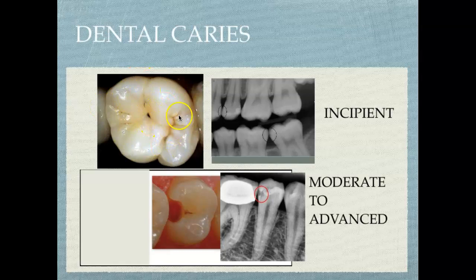So let's look clinically. We might look at a tooth and it has some deep fissures here, that's for sure, and grooves, but perhaps it is just a beginning decay that is diagnosed by the dentist or the hygienist. So that would be classified or categorized as incipient decay. Usually it's in the enamel, but not quite through to the dentin. If you've been in dentistry for a while, this is what dentists used to call out as a watch, which is really not so popular anymore. Usually the tooth is restored in a very conservative way.